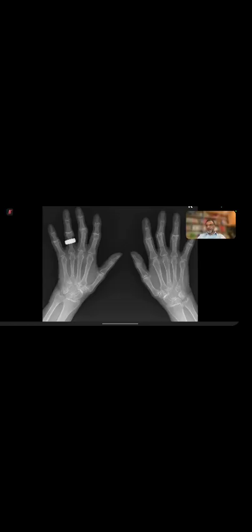Distribution is the same, but look for two things. STT joint arthritis, you can see it here, and also on this side. A patient can have one of these or both, STT or first CMC arthritis, and look at the gender of the patient. Mostly these will be females. I cannot explain why it is more common in females, but it is seen in females.